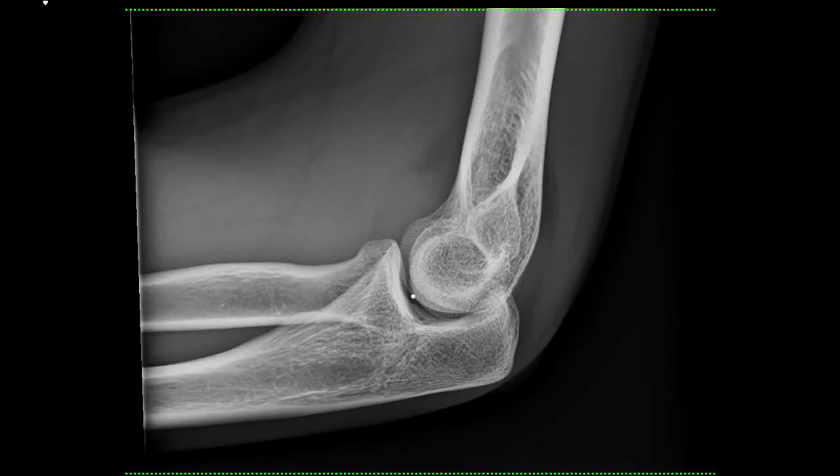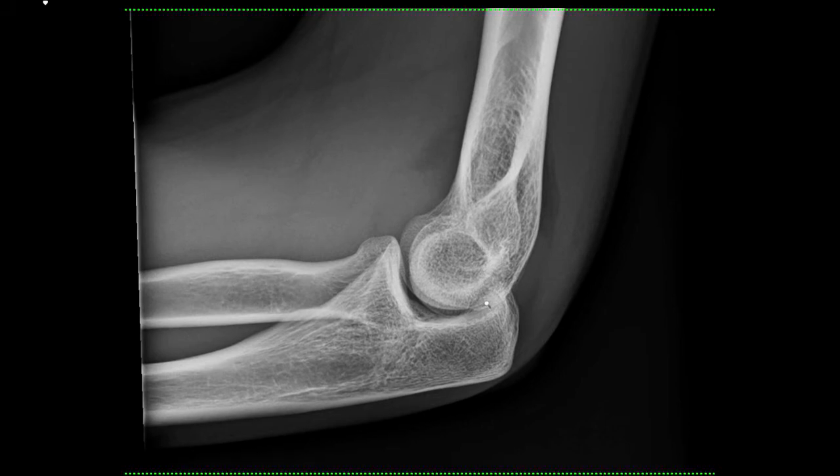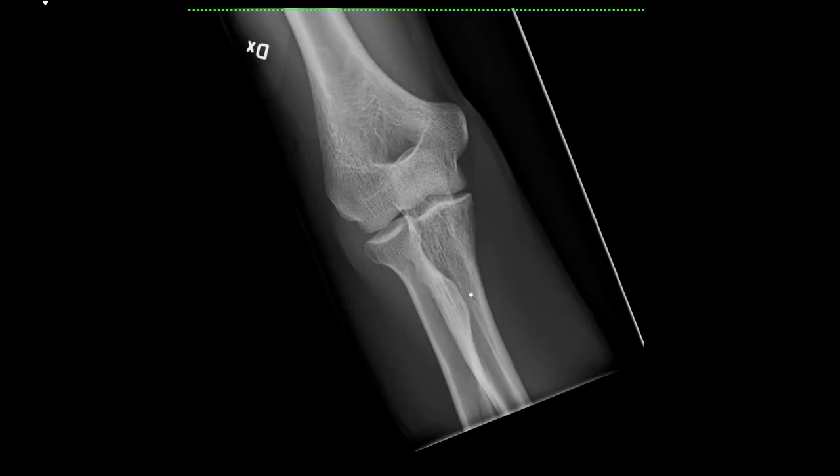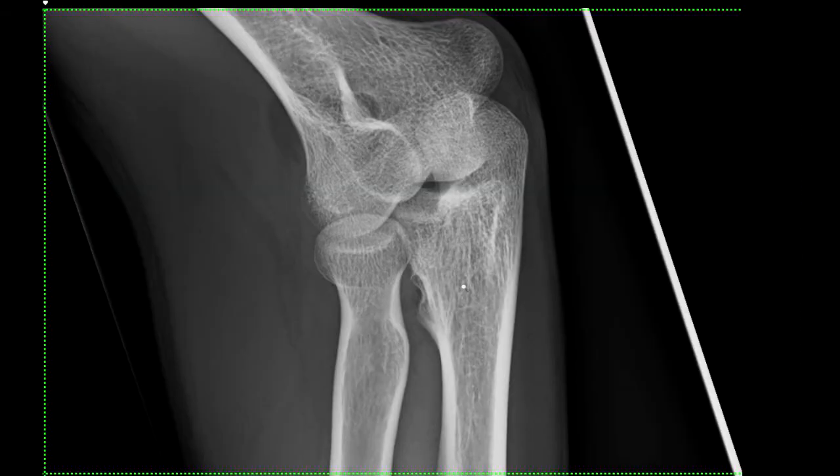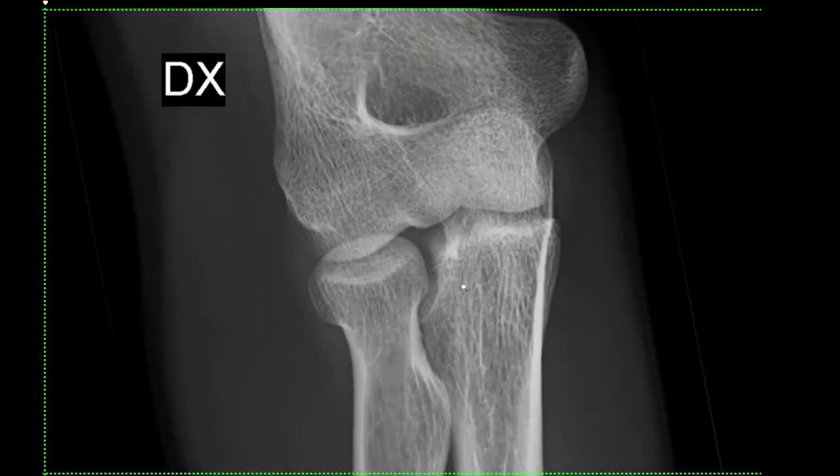Here, guys, I want to show you another fun case. The first thing that pops into your eye is, of course, these crazy sail signs. You can see so much fat there, which means that blood has just moved all this fat away. I'll be a bit fast with this one because I have something else to show you, but I don't see anything here, neither do you. Nothing here, guys. Do you see anything? I don't see anything. Even this close up, I don't see anything.